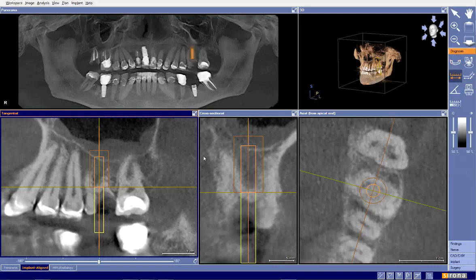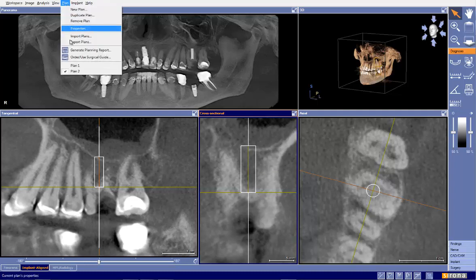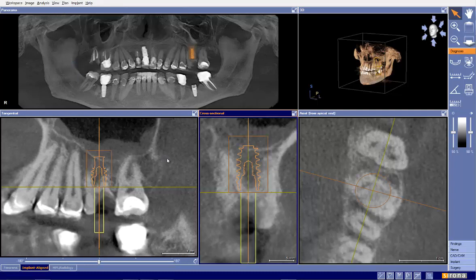Let's just measure here. So right here, top of the implant to the base of the floor. Do that again. Top of the implant to basically the base of the floor is 8.87 millimeters. So you do your 8-9 millimeter drill, and then you up fracture, and you should be good to go. So I would beg to differ that this could be placed with an immediate placement.